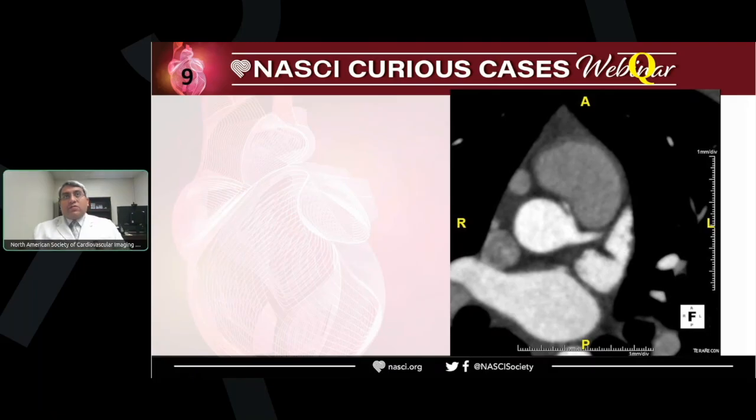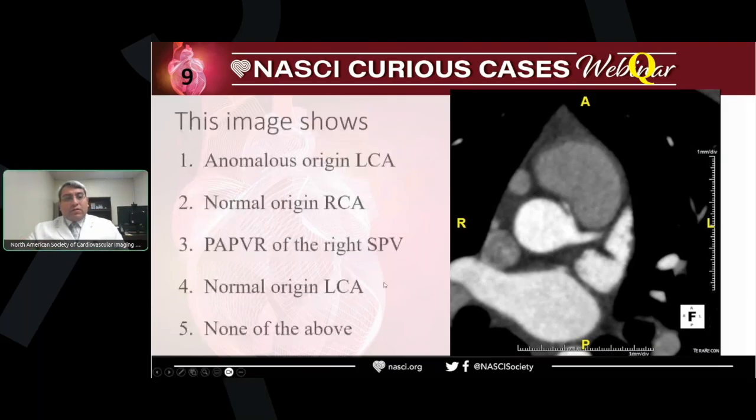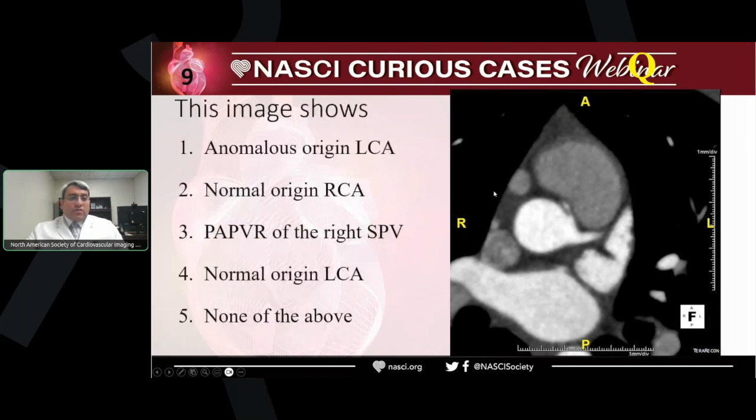So there are different, malignant, yeah, interarterial course. Interarterial course, exactly, and sometimes we call it malignant course of the RCA because it could be compressed during systole between the two arteries or during the movement of the aorta and can cause decreased blood flow to its supplied area in the right side of the heart or inferior part of the left ventricle.